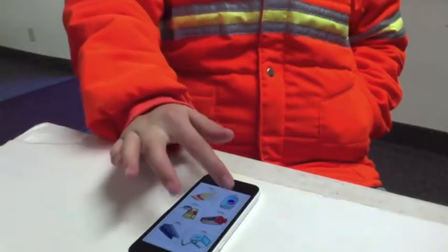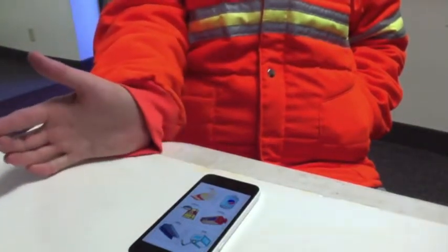Alright, we wanted to show you a real life example of how to use Sounding Board. So we got my friend here, Brandon Bergen, and I showed him how to use the device on my phone that I have downloaded before. We just open it up and I give it to Brandon and I'll ask him a question like, hey Brandon, what do you want for a snack? Pop. Do you have any money in your pocket? Push it one more time.